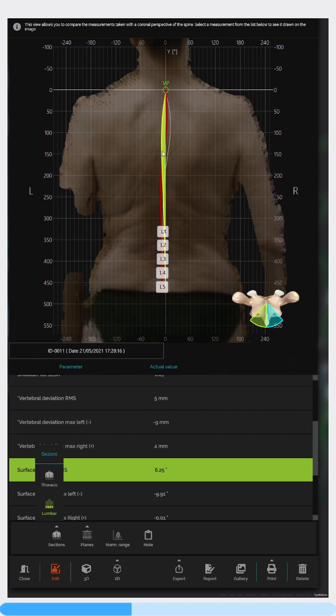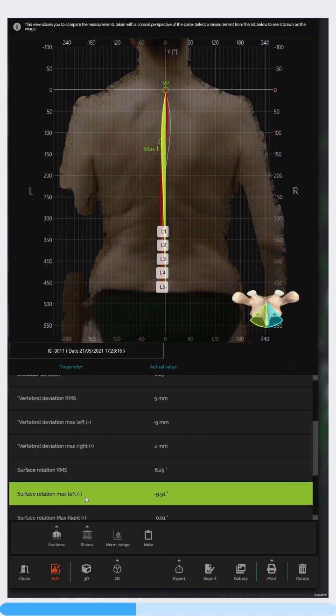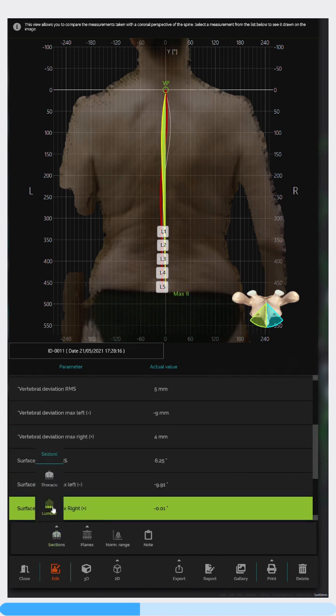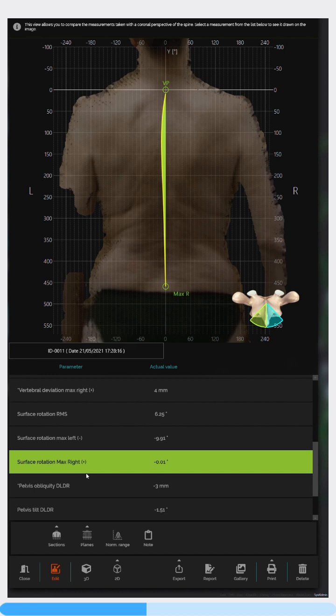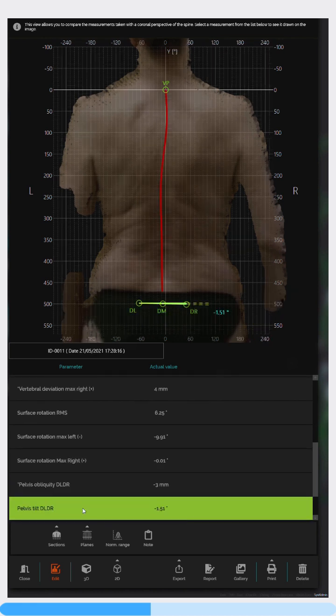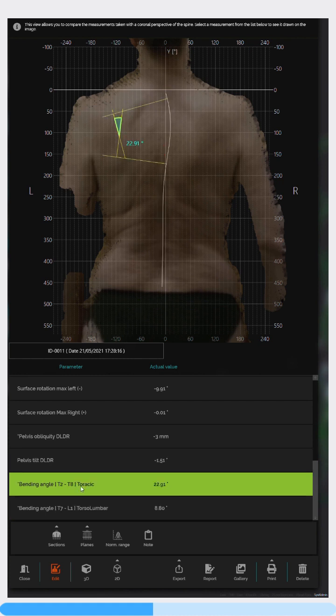So you can see this would be spinous process, which is rotating to the left, which is actually thoracic body right rotation. And you can remove or add in as relevant. And so you can see this person has really subtle rotation, possibly not visible to the naked eye. And this is causing a huge amount of torque in their mid-thoracic.